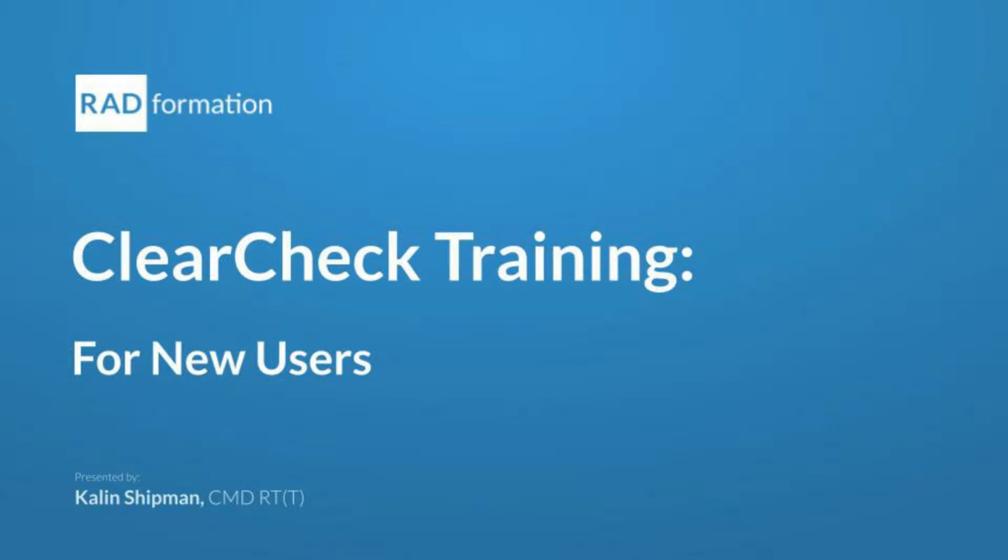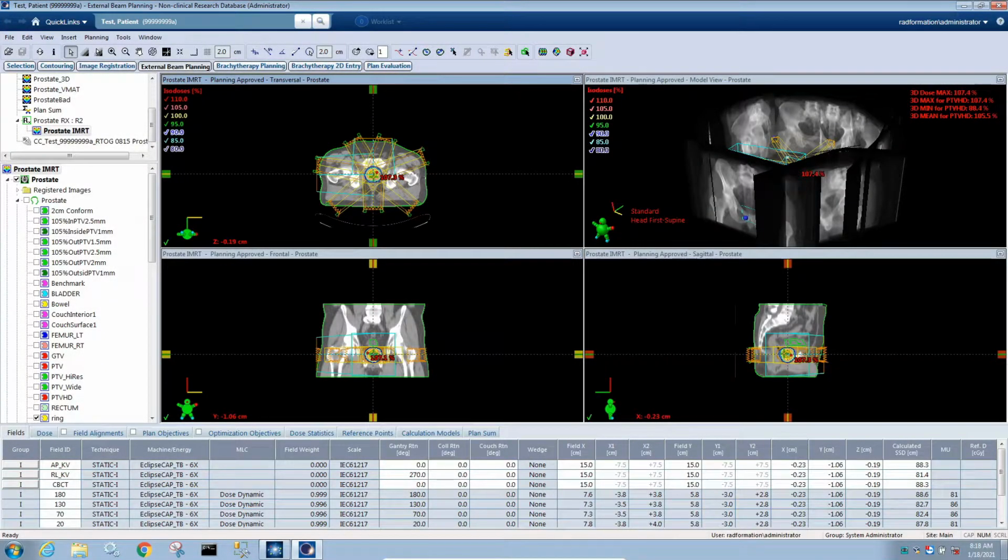This video will go over the basic workflow of ClearCheck, adding and editing dose constraints, using collision check, as well as the many features that are available within the ClearCheck module. To start off, I have a very classic 7-field static IMRT prostate case.